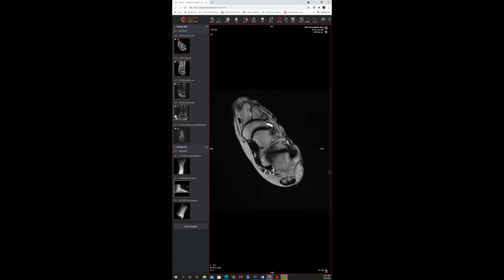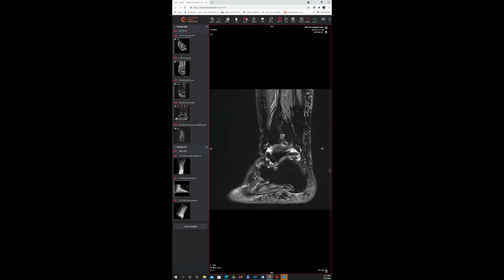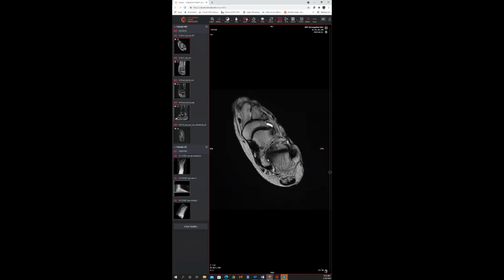One thing I left out for the advanced is that there's likely going to be an extra-articular posteromedial talocalcaneal coalition, with it at least acquired with this functional degenerative changes occurring along the anteromedial aspect, which we can see a little bit better over here in this region here.